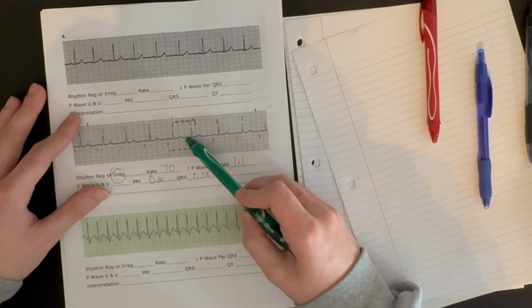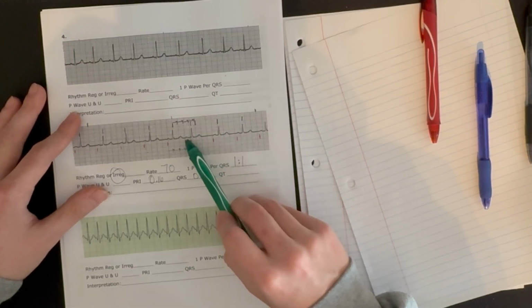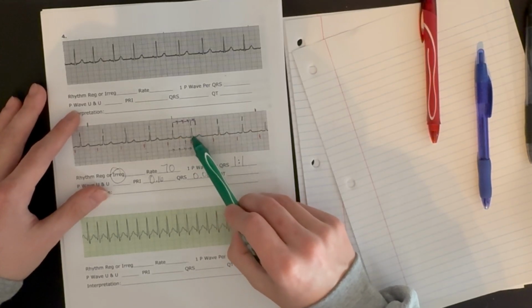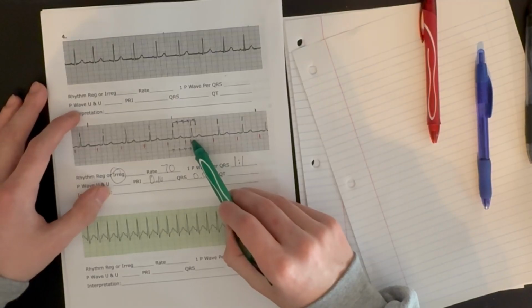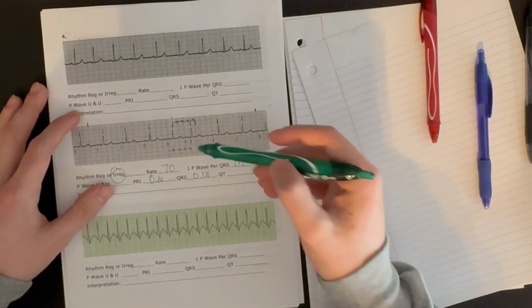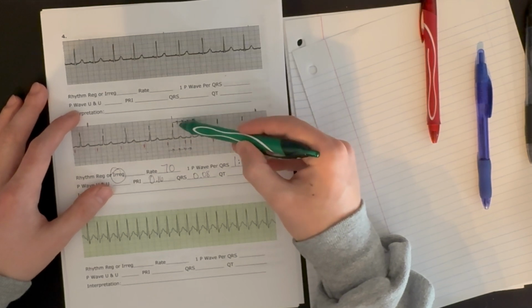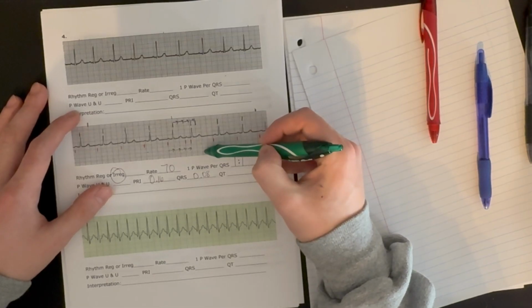Look at our P wave. Is our P wave a normal shape? This being an upward deflection semicircle shape. It's very small in amplitude, but we do see this upward deflecting semicircle. Is our QRS complex wide or narrow? It's narrow. It's 2 small boxes. And what does that tell us? It tells us that the signal that depolarized these ventricles was coming from above the ventricles, taking the normal conductive path, not from inside the ventricles.